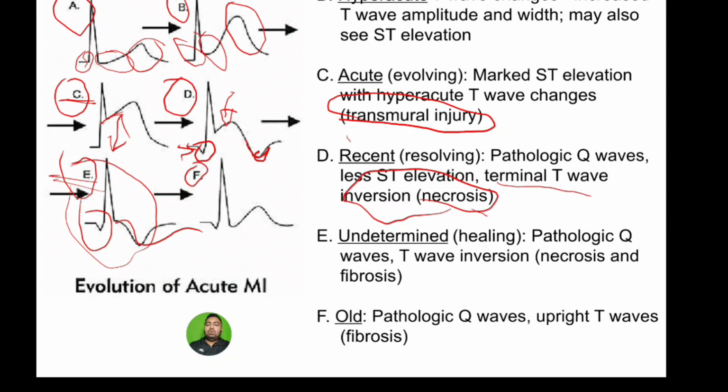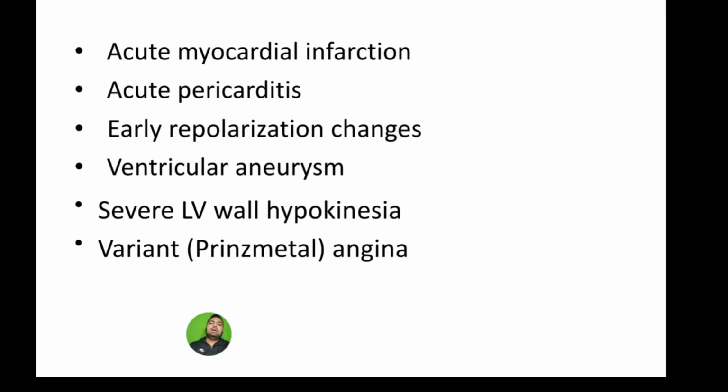So whenever there is old MI, there is the presence of Q wave, ST segment has normalized, and T wave inversion, which was there previously, has settled down. Okay, so now let's move to the next slide.